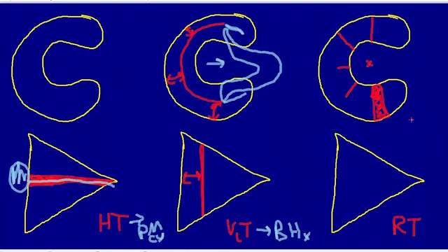So you need to be familiar with a few signs to recognize the radial tear. Probably the easiest one to conceptualize is imagine having a plane that's parallel to a full thickness radial tear, meaning that I'm going to create a sagittal plane. Here's image 1, here's image 2, and then here's image 3. You'll see that this full thickness radial tear, when it's parallel to the plane of imaging, you'll wind up seeing the meniscus, then the meniscus will disappear for a slice, and then when you go to the next slice, the meniscus will reappear. This phenomenon where the meniscus disappears for a slice is referred to as a ghost meniscus sign, and this is pathognomonic for a radial tear.